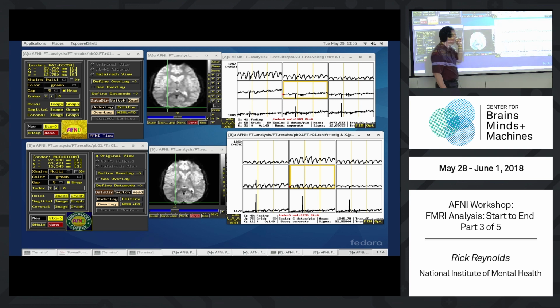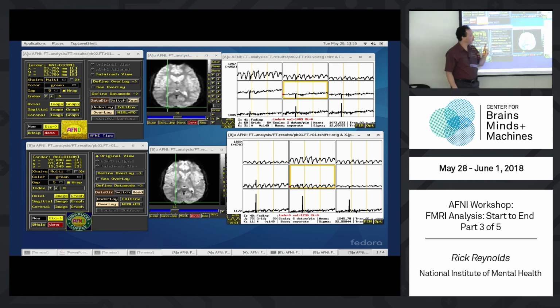Well, that's true for basically every voxel in the brain except where we're at. Since the coordinates, no, it could be for where we're at too. How does that? I have to ponder exactly how that's worked. The goal is to keep the coordinates, no, it should be like applying this. So we should be in more or less very close to the same spot.